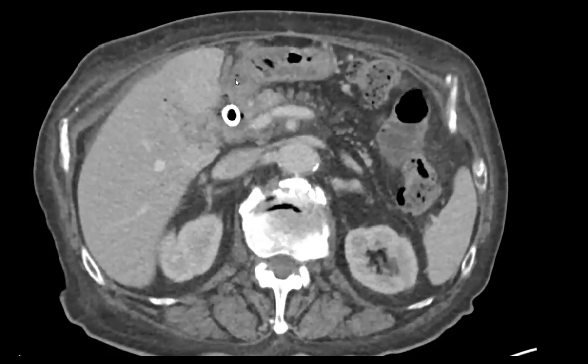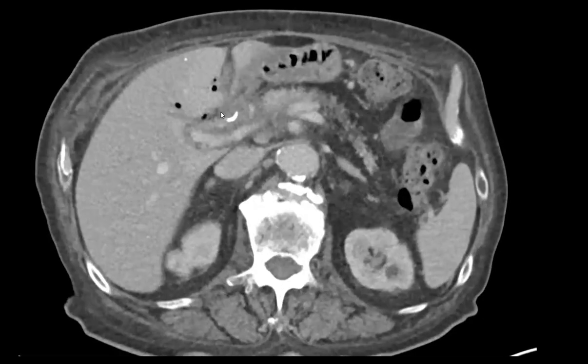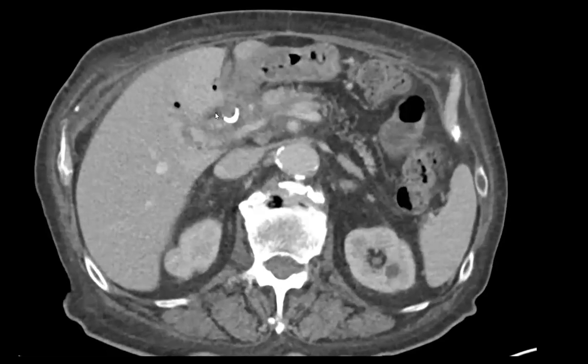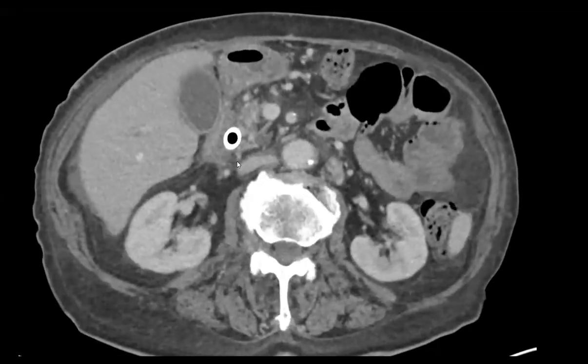So on this part here, this is the gastric lumen. The stent is actually crossing in through the stomach, and it has fistulized the left hepatic ducts, and this is where the proximal aspect is. So this is a choledochoduodenal or choledochogastric fistula because of the metallic CBD stent.